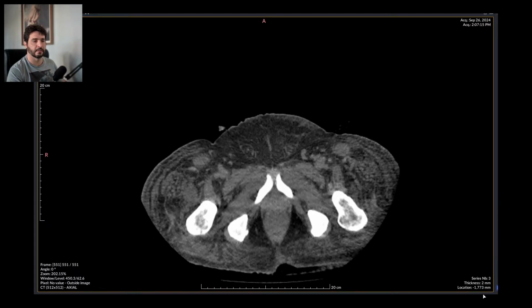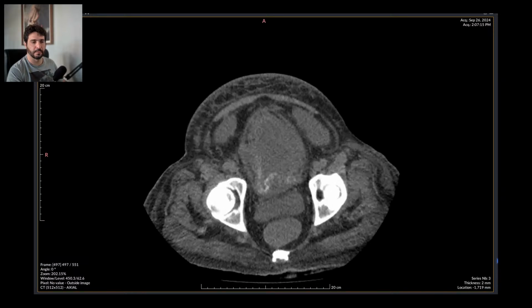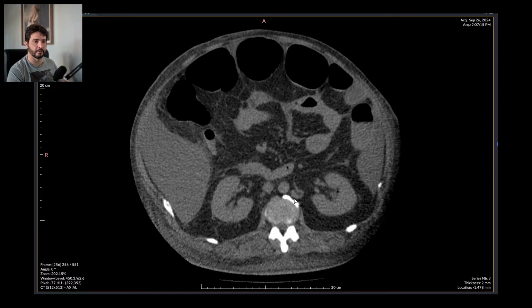It's just that stupid. I can even see the prostate and the pelvic floor right there, not the end of the rectum. It's just stupid. It just makes no freaking sense. Can't just send a scan like that over for reporting, but it is what it is.